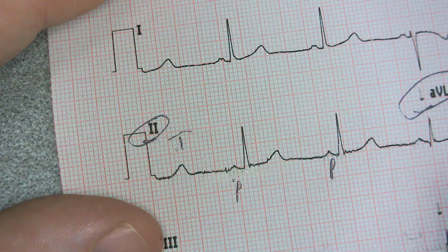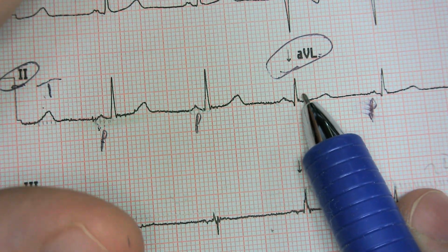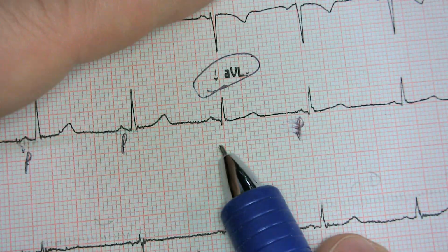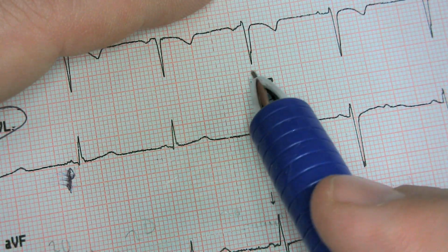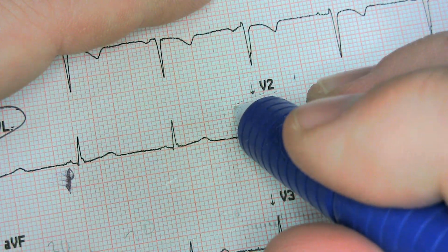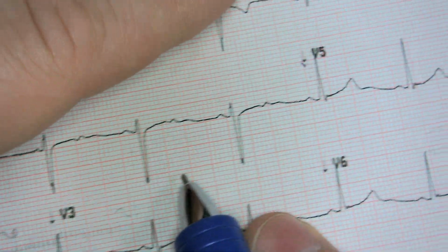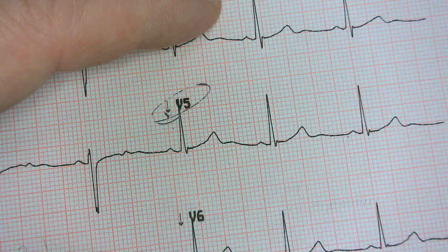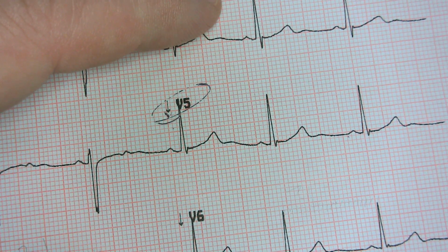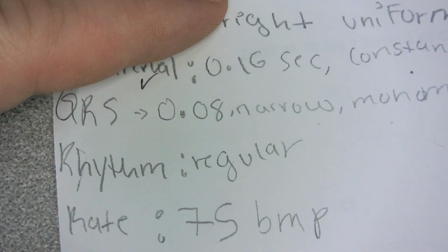When we look at these QRSs, all these QRSs look the same. Well, they don't look the same over here. You're exactly right, because once again, we changed our viewpoint. So when we use this viewpoint, they all look the same. Well, look, it's changed. Well, yes, so is our viewpoint right here. So in this viewpoint, though, they all look the same. We went to Olive Garden. Well, look, it's changed. Well, yes, because now we're at Sam's Club. We changed our viewpoint. So when you change your viewpoint, you change what you view. Does that make sense? So yeah, this is indeed monomorphic. All the QRSs pretty much look the same as long as you keep the same viewpoint.